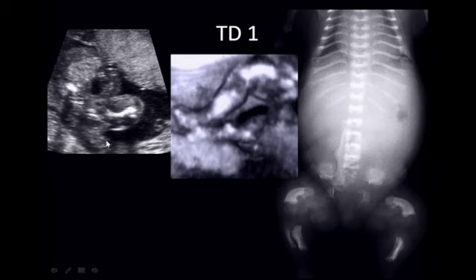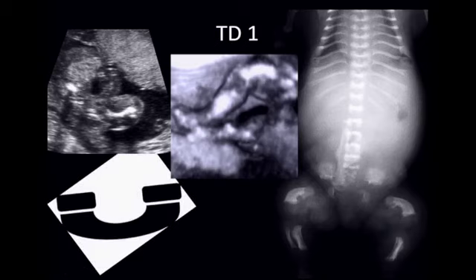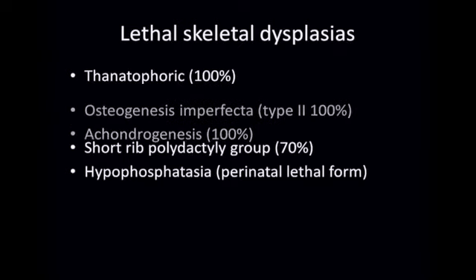TD1 is associated with a very characteristic appearance of the femur. It is very shortened and curved. Here's a 2D, here's a 3D, and here's a radiograph of this typical appearance, which was described as the telephone receiver femur. Now, unfortunately, for the generation of sonographers and medical students coming up, a telephone receiver looks nothing like that. It's now a smartphone and is shortly going to be just a piece of tape you stick on your forearm. But it was originally described to illustrate the fact that it was short with curved ends, just as you would pick up an old-fashioned telephone.